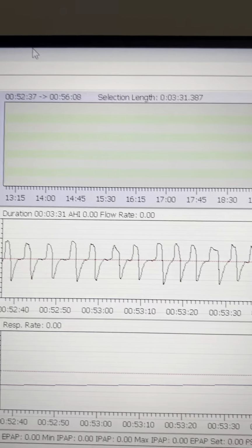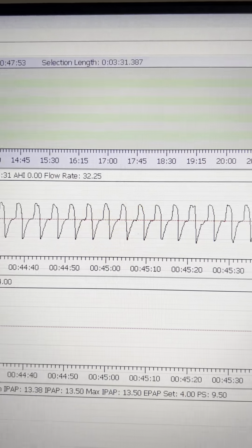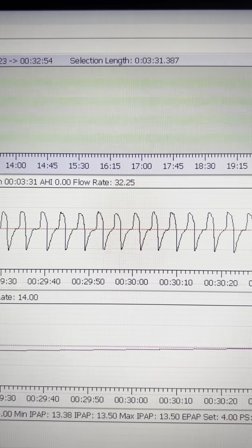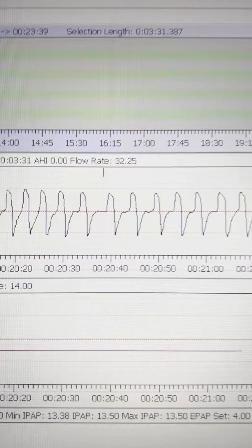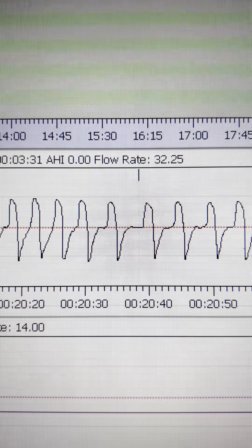Like for here, you can see with the Philips one I showed you earlier, when it actually gave me extra breathing, I didn't wake up from it. Where was that? Right here, you can see it too. I stop breathing, it gets the backup rate.